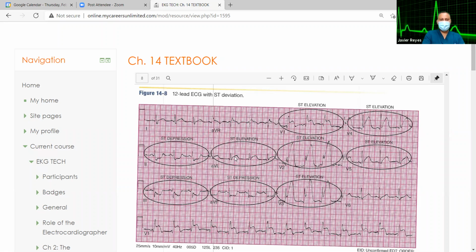In V1, Janie, what do you see in V1? V1, the one that's all along, the longer one, the 6-second strip. What's real obvious? Exactly, the tombstone, right? What do we call that? What do we call the tombstone? That's a nickname, right? But what is the actual name of it? We just talked about it like a million times.